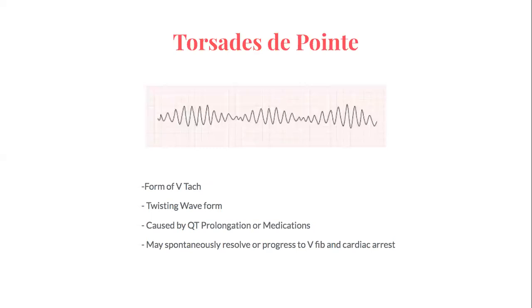Torsades de pointes is a type of VTAC in which you see more of a twisting waveform. This can be caused by QT prolongation and other medications, and it may spontaneously resolve or it can progress to VFib and cardiac arrest.